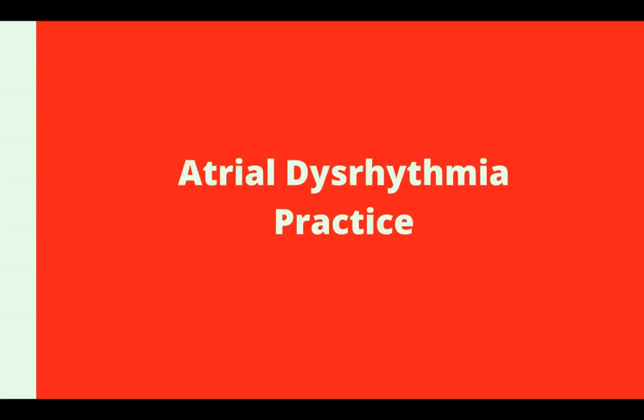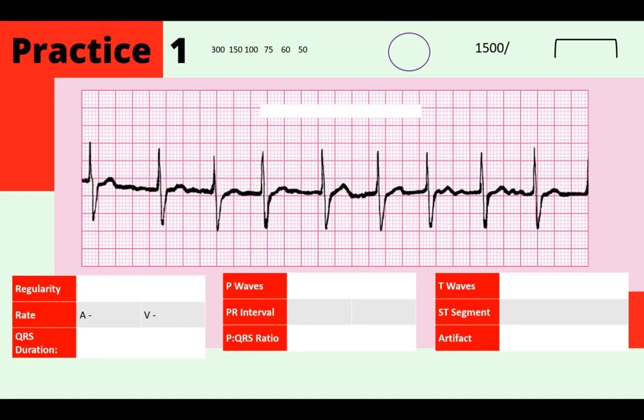Okay, welcome back to another atrial dysrhythmia video. In this video, we're going to walk through a couple examples, so hopefully you can see how the step-by-step interpretation leads to your final EKG interpretation diagnosis. So here's our first rhythm here. Okay, let me make sure I'm ready.